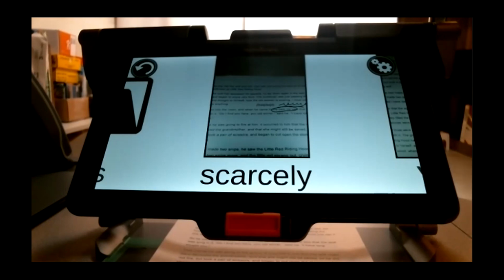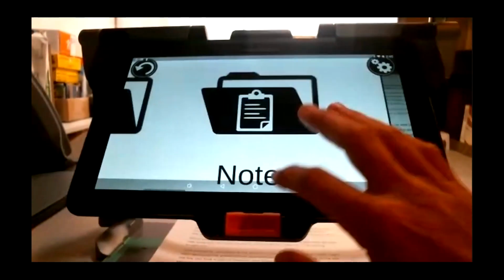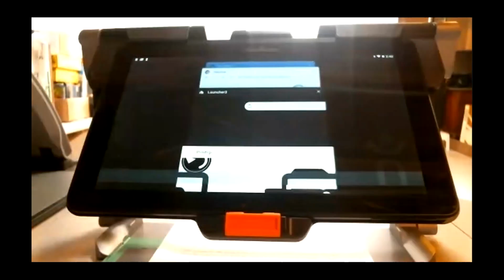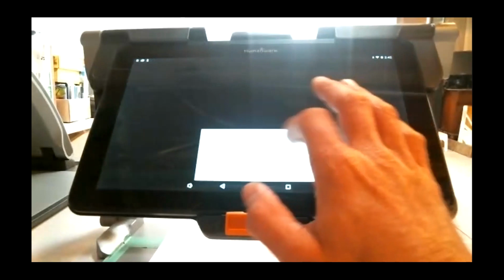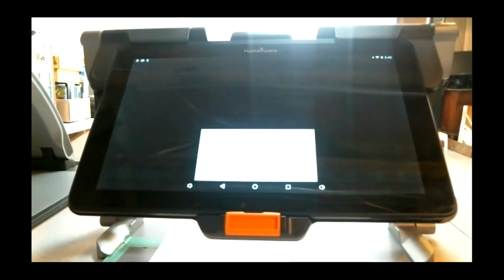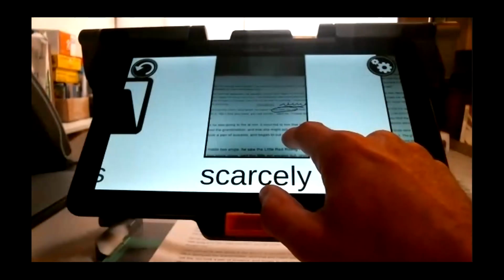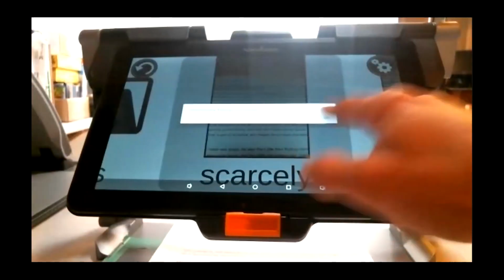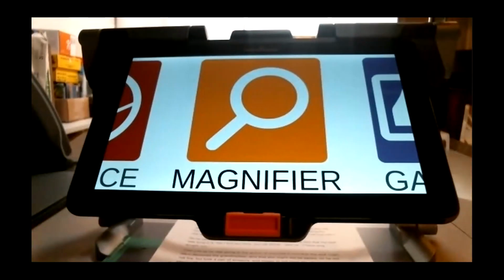So somebody asks, can you export from the gallery? Absolutely. And let's try to fix this here. I can't seem to show you the action menu that I'd like to in my gallery. But yes, in the gallery, if you press and hold, please work. It doesn't work. When you press and hold on that menu or on, let's try it. I know. Haha, I found a solution for you guys.